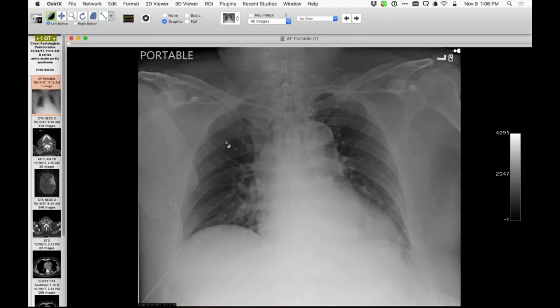This case evolved in the following fashion. Actually, before I tell you, because there's some findings on this radiograph that relate to previous surgery, I'll just tell you about that. So the person was admitted for a stroke to our hospital. And this radiograph shows a stent in the aorta, which he had some years ago for treatment of, as far as we know, dissection. And it turns out that he also has a left carotid to subclavian bypass. And then he also had a second operation subsequent to that, involving the thoracoabdominal aorta, which you can't see here, but I'll show you a bit of that.